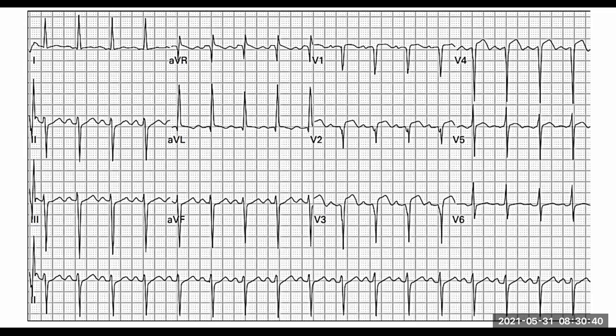And what did we say we call these waves? These negative deflections that are quite wide and deep, although maybe you couldn't argue with it here, but let's just say for interest's sake, all right? What would you call them? Q waves, isn't it? So even though this is not technically a Q wave, you can see it's got this little thing here. So this is actually a bundle branch block here, right? An incomplete one. But anyway, we're not going to be too worried about that right now.